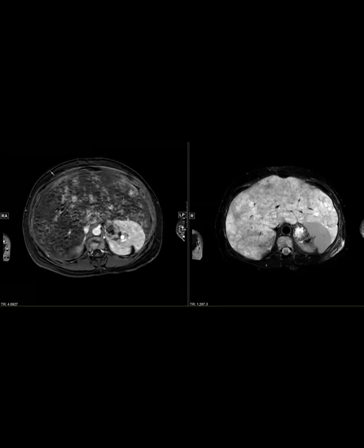I have a question. For HHT, usually the hepatic artery is very dilated. Also, hepatic veins are very dilated. In this case, the hepatic veins are very narrowed. I was thinking more toward Budd-Chiari, some type of thing. No, I mean the reason everything was compressed is there was mass effect from the parenchyma being completely replaced by this process. That's a really cool case.